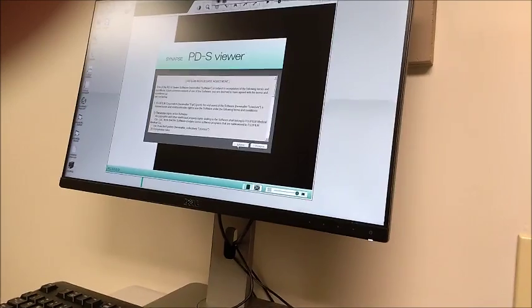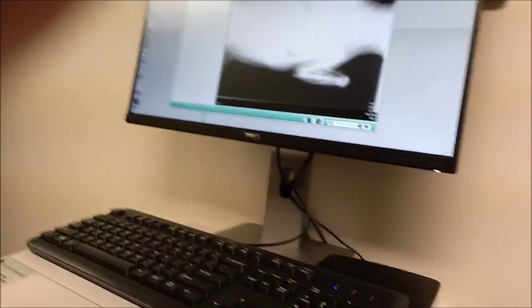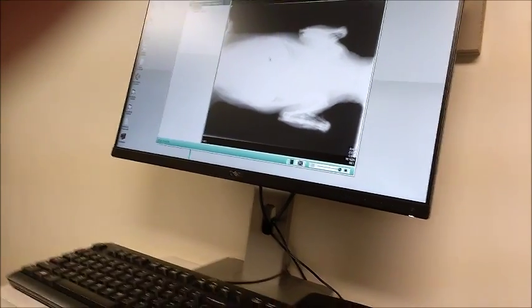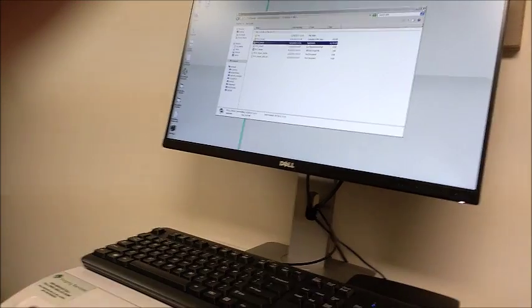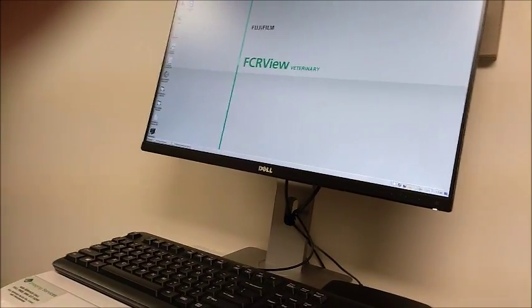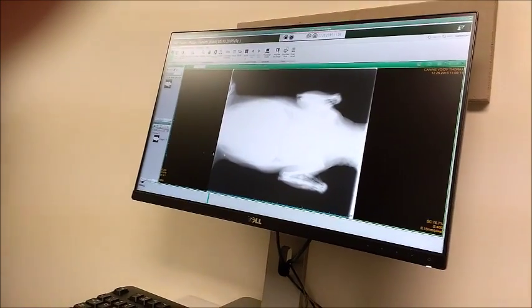But should you have checked something? I should have checked the box that said launch viewer automatically. Well, I thought maybe you did check that, but the thing is, we didn't open this and close it again. Oh, we did open it. Well, go close it again and see what you would have to change.